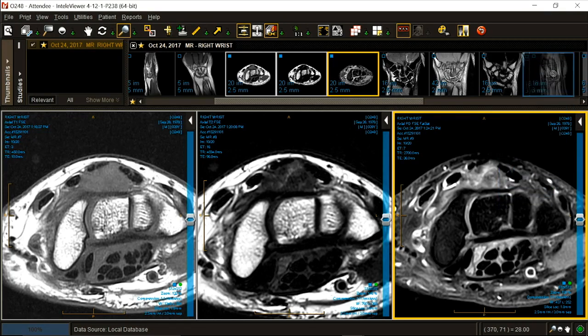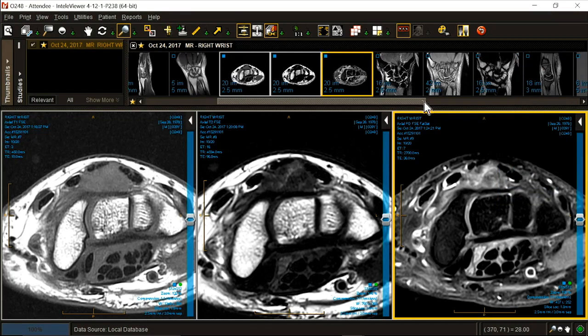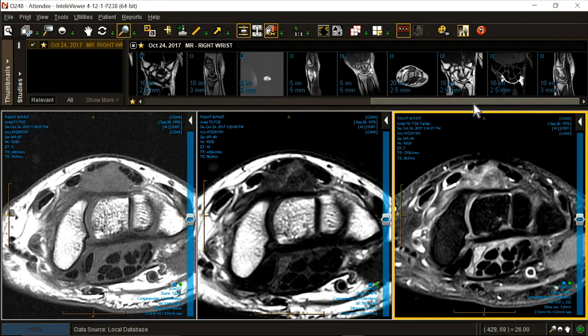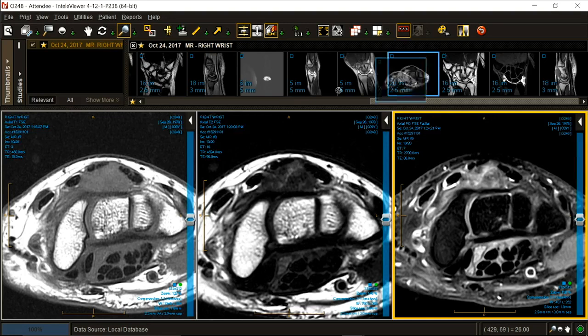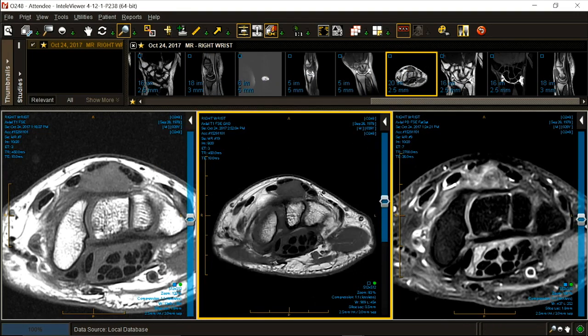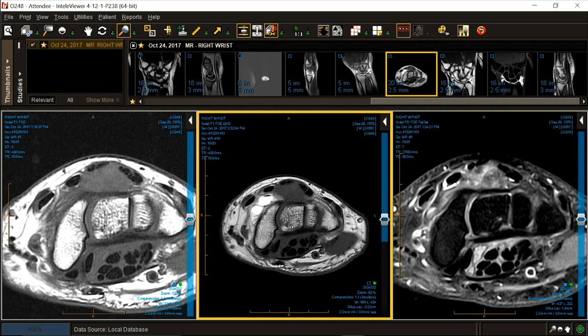Okay, now it's time to bite the bullet. I'm not going to put the sagittal up. I don't think it adds a tremendous amount. Let's put up the contrast study. Well, they put contrast in the joint. Why? Because they wanted it. It adds absolutely nothing to the case.